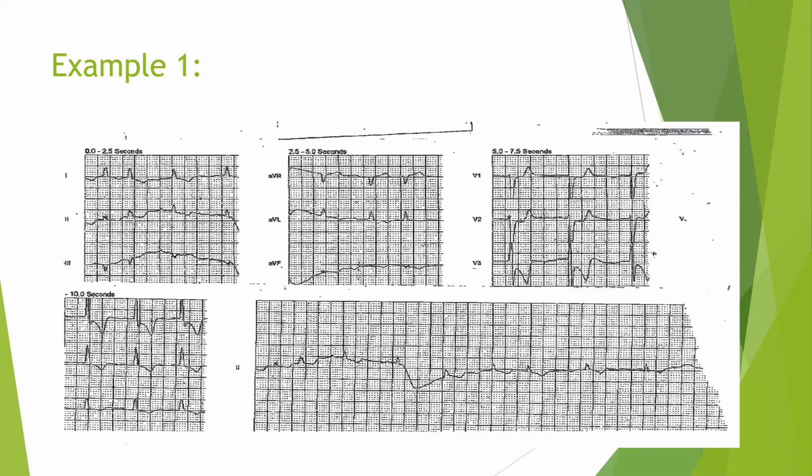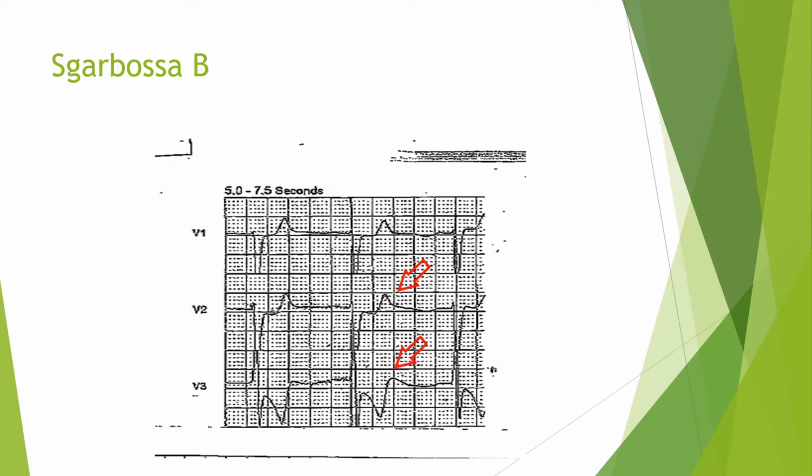If you look at this for a second, this is a little abnormal. So it is a left bundle. You can see in V1 and V2 and V3, you have the downward QRS complexes, and the QRS complexes are wide. V6 is upright with a discordant T wave. That's a very common presentation for left bundle. But if you look at this for a second, there's a couple abnormalities, and I'll zoom in where we need to focus.